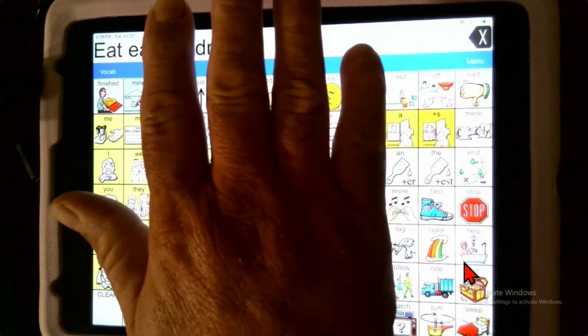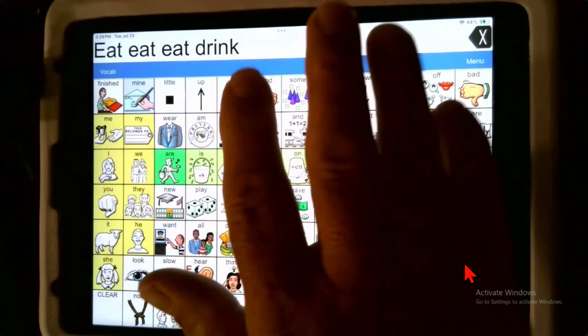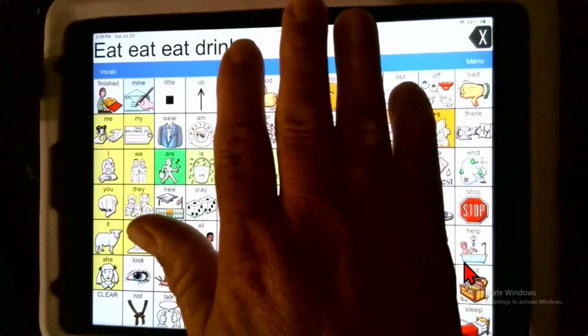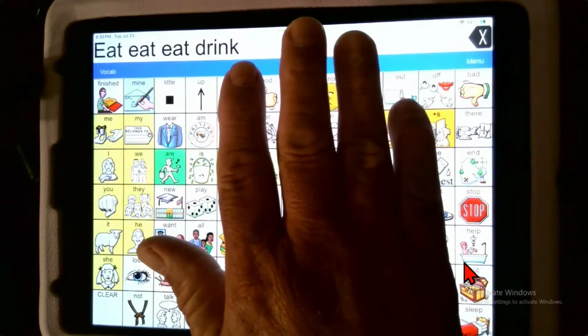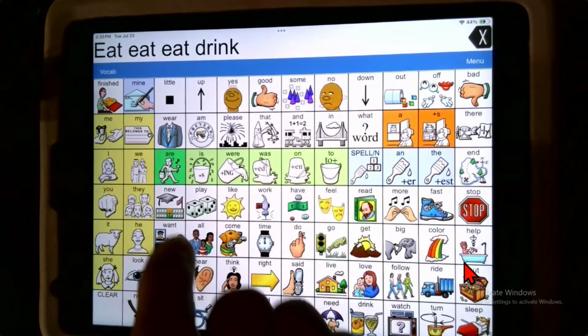And so right now I'd have a second iPad. I'm sorry, I don't have one in front of me. I would slide a second iPad in here, and that device would have Vocabulary Builder on it. So Vocabulary Builder is used on the second device, the therapist device, the teacher's device, the classroom device, but it's not used on their device. And you slide it over the top and let them have access to it.